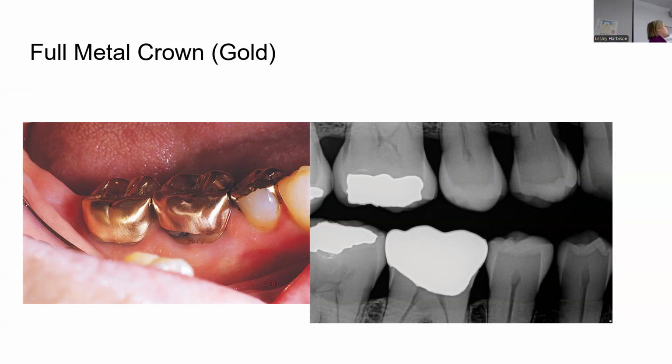So it's going to have a much smoother appearance. With amalgam, the dentist preps the tooth, drills out the tooth, pushes the amalgam down into it, and then carves the top of it. So it's going to have much more irregular lines, where a gold crown is going to have much smoother lines.